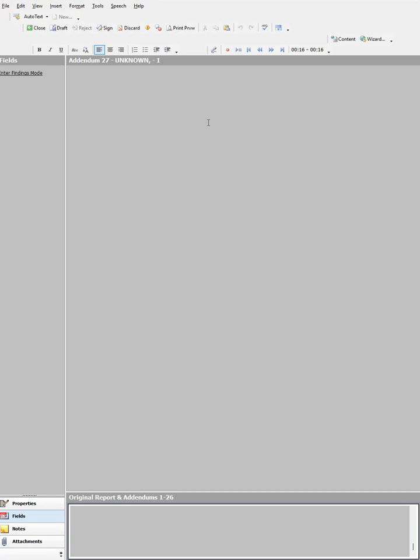Another video on findings mode. So as a background, if you've never used the findings mode, you can kind of think of dictation. There's kind of two ways to do it. One is freeform, where you start with your findings mode completely blank and you just dictate completely from scratch.